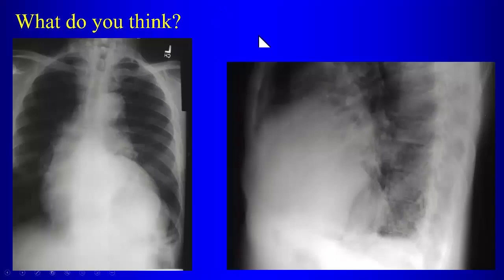So over at Beth Israel, here's another patient who also has a history of a recent myocardial infarction. What's abnormal here on the chest radiograph?